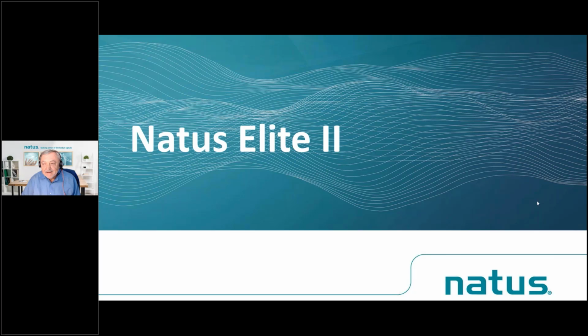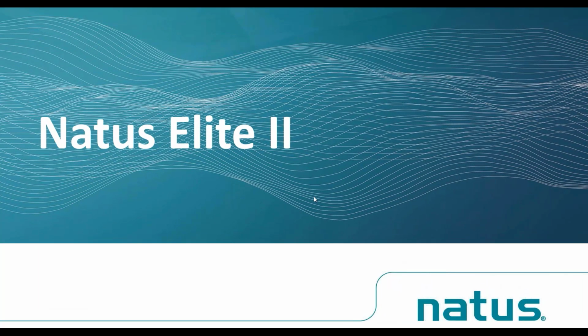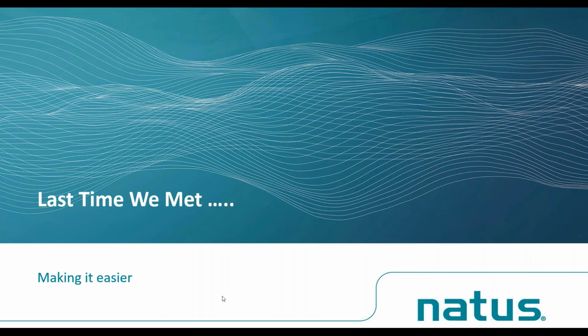Good morning. Thank you, George. So welcome back to the Natus Elite Tour. This is part 2, as indicated by George. Before we start our tour, let's just look at what happened in the last tour. Our focus was mainly on the nerve conductions and needle EMG.